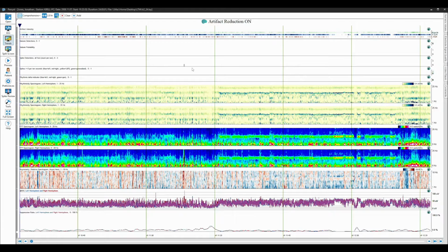We are looking at 2 hours of EEG, and there are a couple of detections which you can see in the middle of the page. I happen to know that those are false positives due to electrode artifact, but that's not very many false detections to look through in that much EEG time. We'll get to some more interesting aspects of spike detection later, but one important feature is that you aren't going to get hundreds of false detections, making it more time-consuming than it's worth. The next trend has to do with spike rates, and I'll get to that in more depth in some other records.